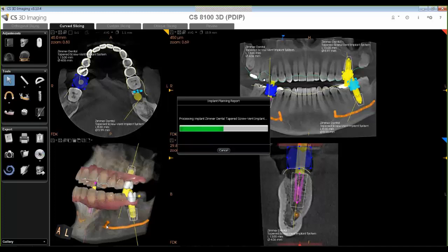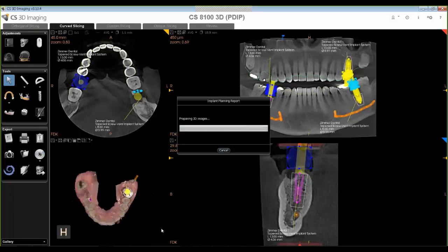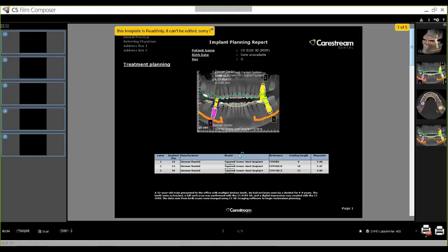to grab not just the 3D rendering and the angle that I've chosen for it to show at, but it's also going to grab an occlusal view of the maxillary model and the mandibular model, 1 and 2. And then it puts this all into an interactive Adobe Acrobat PDF, a portable document format. In other words, something that everyone has and is able to open on their computers.